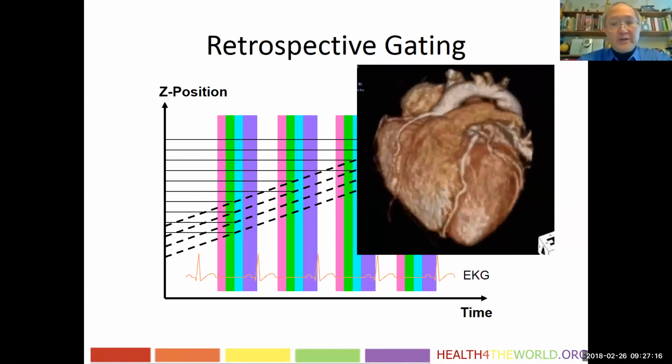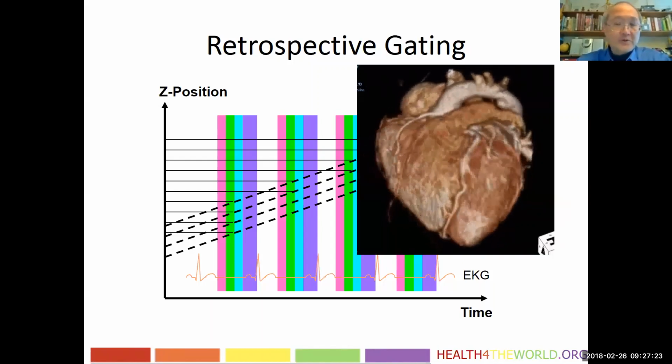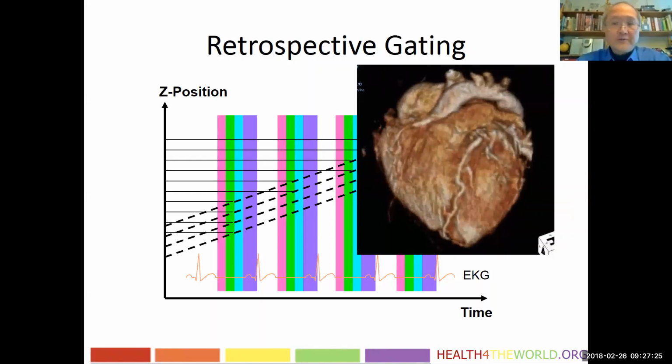And by doing so, you can actually look at the tumor, how it moves inside the heart, and where the major structures that it might be close to are, such as coronary arteries and the valves.